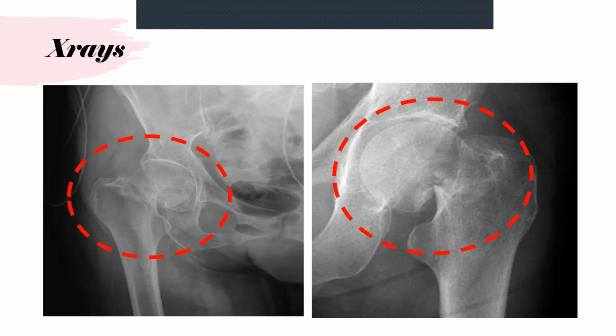So how do you manage these patients? Here we can see some of them. So that's more through the middle. That's just below the head of the femur. Sorry, that's quite a distal fracture.